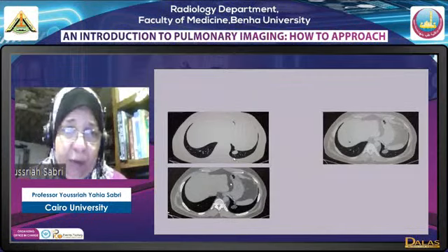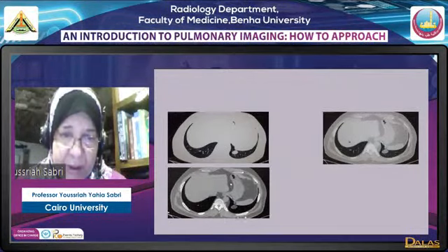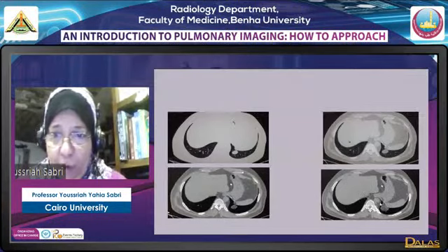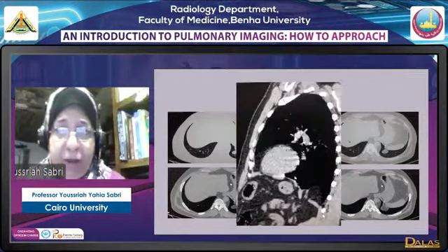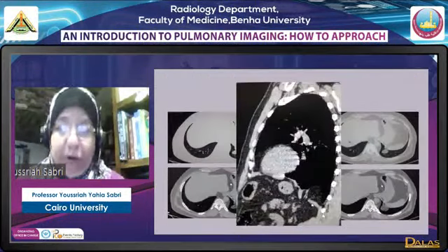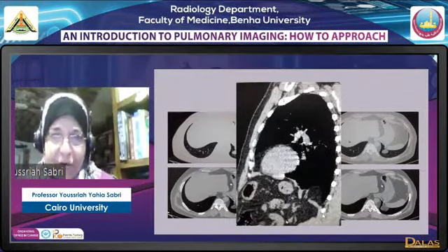So here we have a very suspicious lesion, a single pulmonary nodule. Shifting to the lung window and the mediastinal window, what we had is an appearance suggestive of fat. Going through the mediastinal window, there was a suggestion that there is a perforation or an opening in the diaphragm here, a defect. Reconstruction images showed that we actually have a defect in the diaphragm, and this was nothing but a small diaphragmatic hernia with fat, a Bochdalek hernia.